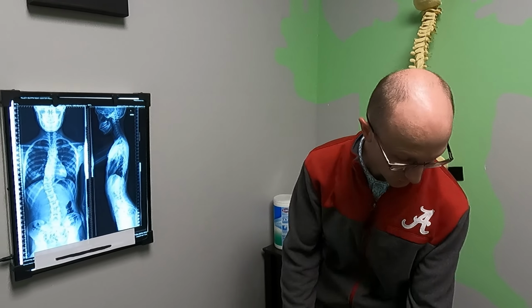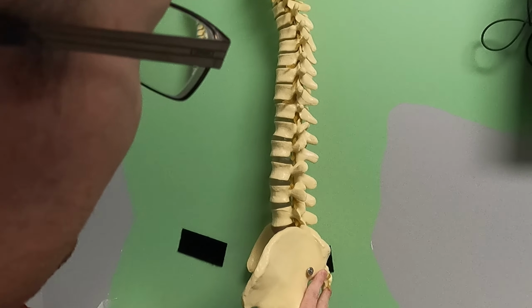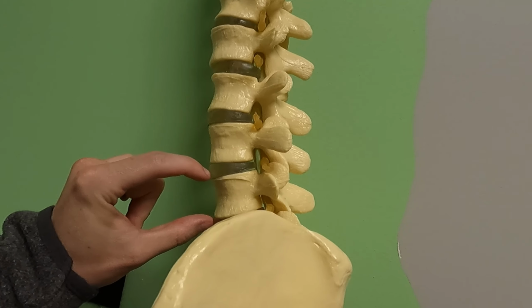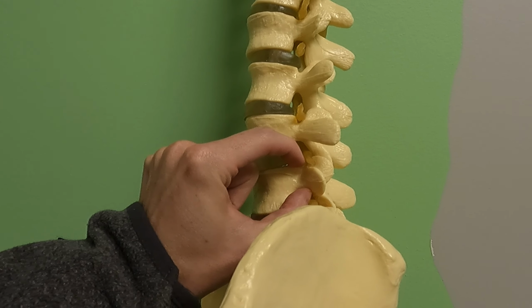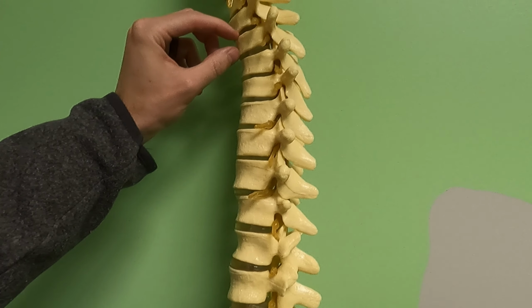And that's actually a normal occurrence in a part of the spine that has a lordosis. You can see how, at least here in this lumbar vertebrae, this side is going to be a little bit longer than the posterior side. And up here, typically it's the opposite.